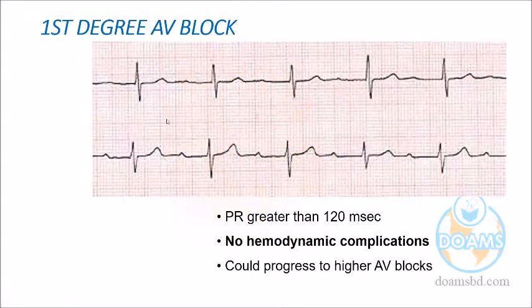And we are going directly to the block. As in many previous classes, we have shown a normal ECG. So this is not a normal ECG. Already we have decided what is wrong here. Please have a look: first degree heart block. So there is the P wave, this is the QRS complex and the T. If you go here and if you see here also, the initial P wave is brightly visible. This is the P wave and this is the T wave.